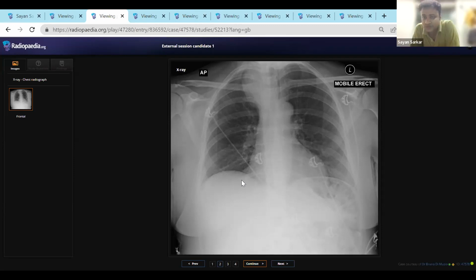What are the ancillary features if it is a posterior mediastinal lesion? What else will you look for? There could be rib erosions, some vertebral body erosions. Can you see any of those things here? The ribs look okay, the anterior end of the clavicle, the medial end of the clavicle look okay in this projection. Okay, I get you. So what will you do next?